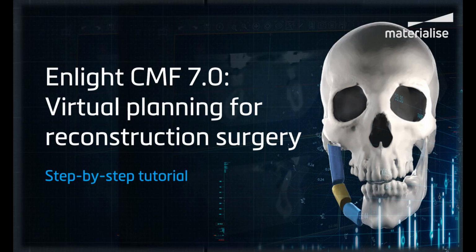First, I will show you the manual segmentation integrated into the software. And then I will show you the automatic segmentation method by using the connection to our Mimics Flow platform.